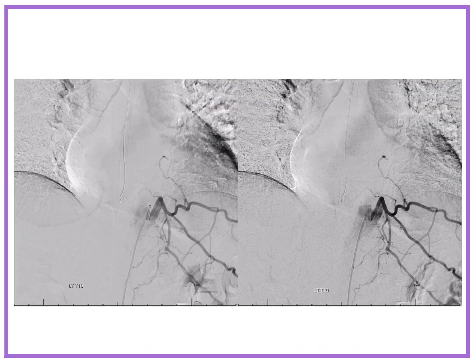Here's a stereo image now. This is a cross-eye stereo. For those of you that know how to do this, we didn't put in the anaglyphs. However, if you were to cross your eyes, you would see more than what meets one eye.